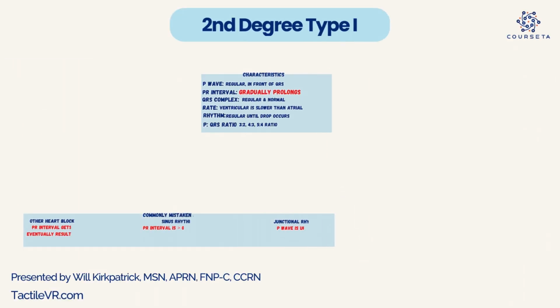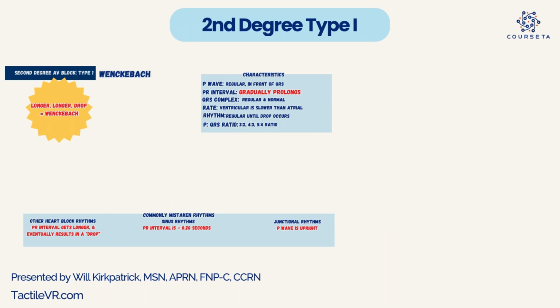All right, so second degree heart block type 1. This is also known as Wenckebach. Now you might already know that a lot of people like to use the mnemonic "longer, longer, longer, drop, then you have a Wenckebach." Well, that actually is a very good mnemonic. I'm not a huge fan of a lot of mnemonics, but that is a good one because it tells you what to look out for.